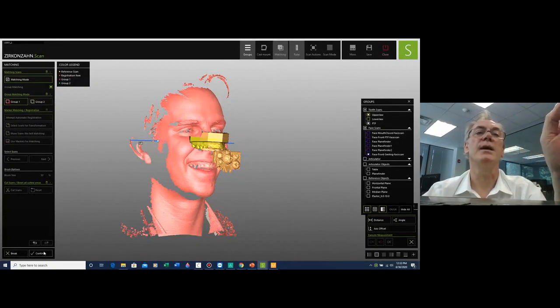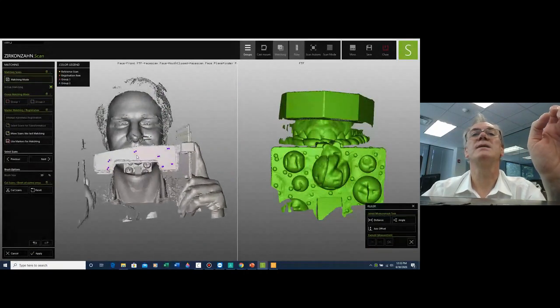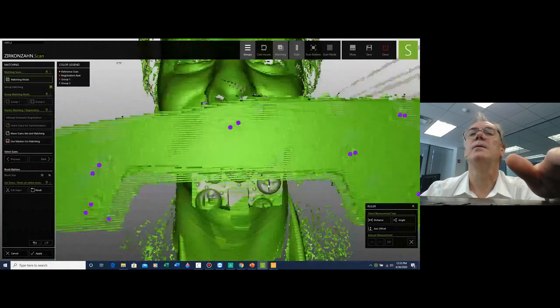So we go ahead and we say, okay. They all pop up on one side. And I am going to go ahead, highlight the area I want to focus the matching on. Locate the spots. I'm going to dot a spot here, a dot here, and I'm going to use this small one down here. And let's see what happens.